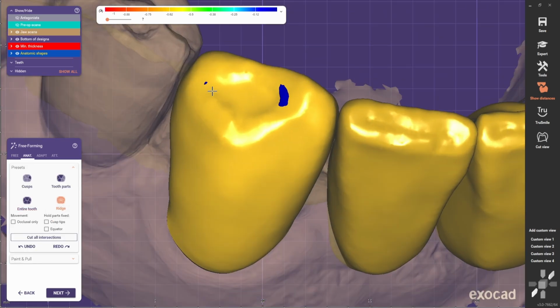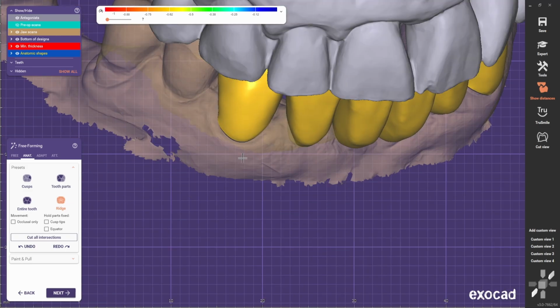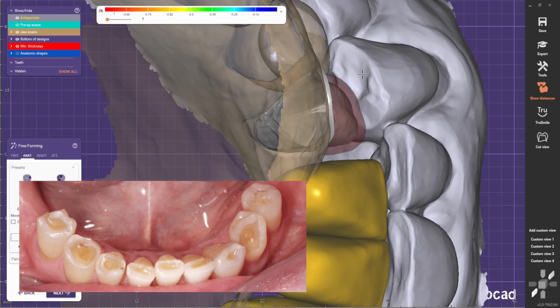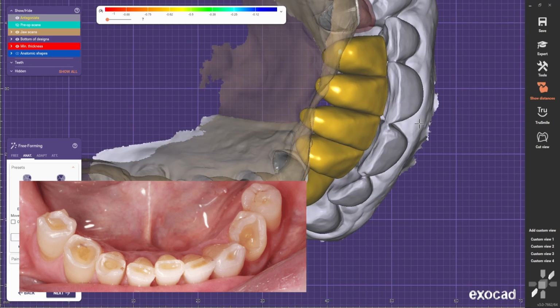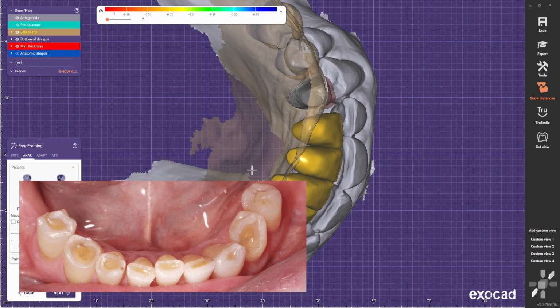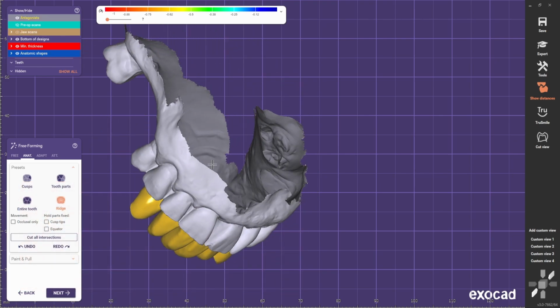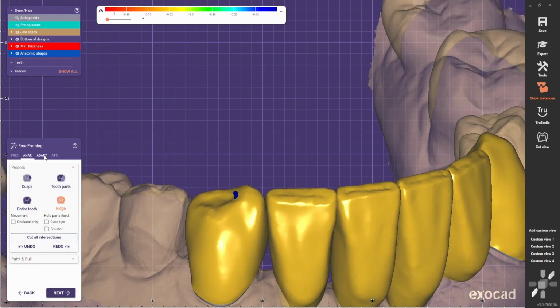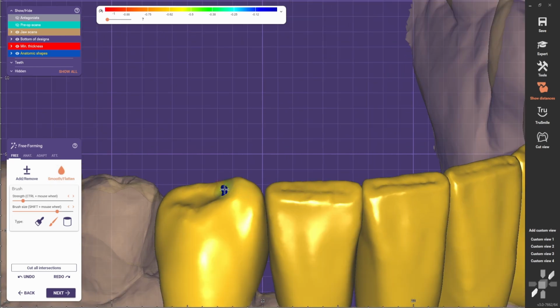So I'm trying to recreate an exposed dentin like we have here on the upper. Like you see a hole almost. Like here on these ones. You can tell it's an old patient. So we shouldn't do young teeth. Unless that's what the patient wants, of course.